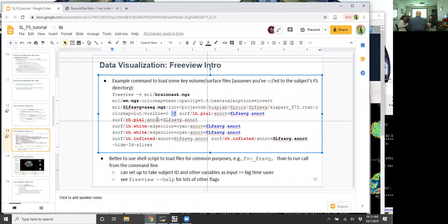So let's say that we run here where we have all this starting blank. Yep. So we can map something in Freesurfer average. Freesurfer has its own annotation file. Yes. So what we're saying is that we know, based on how we're setting up our regions and things like that, our own annotation file. Yes.